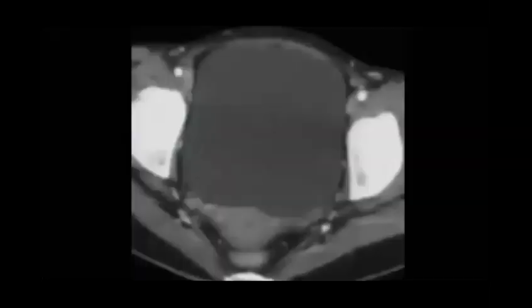You can note here that there is dysplasia or agenesis of the sacrum. Perfect. So you cannot see the sacrum. So there is sacral agenesis. So search for other anomalies as well. Neurogenic bladder is common to see in the pediatric age group.